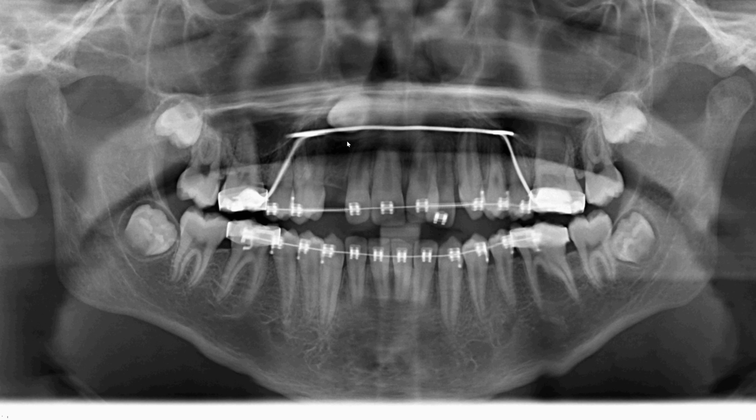But the reason I'm making this video today is this radiographic appearance of the maxillary and mandibular molar. Compare that to the right and left. Something looks very unusual, doesn't it? That root morphology is very interesting, just affecting the upper and lower first molar on the left side only. So what could be the possible explanation for this area?